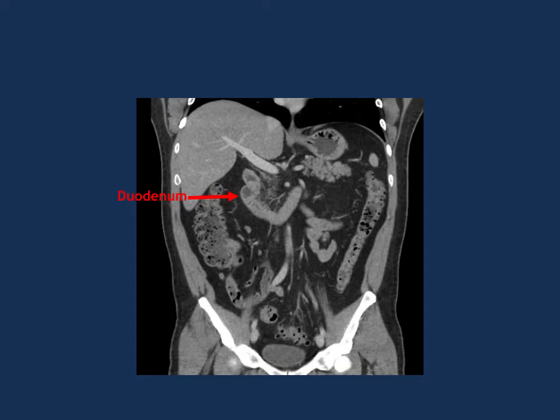The duodenum has 4 portions. With that arrow pointing, probably the second portion of the duodenum, and it comes around as a C loop, and it comes back up. And there's a little bit of fluid in there too. Yeah, okay. You see the bowel wall, the duodenal wall that's bright, and in the middle it's a little darker. That's just some simple intestinal fluid.